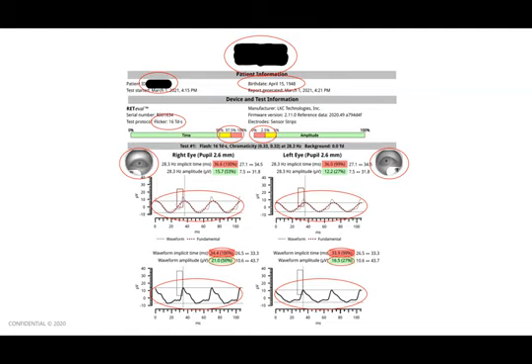If this patient had diabetic retinopathy already, I would be worried that they could be getting worse. In this case, you might be able to see this patient on a more frequent basis just to keep an eye on their condition, or if you're very concerned, you might want to consider either treating this patient or referring them on for treatment.